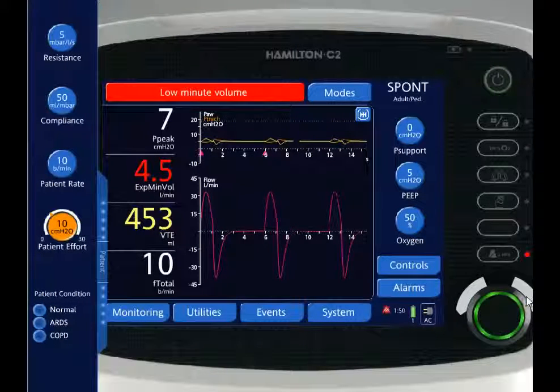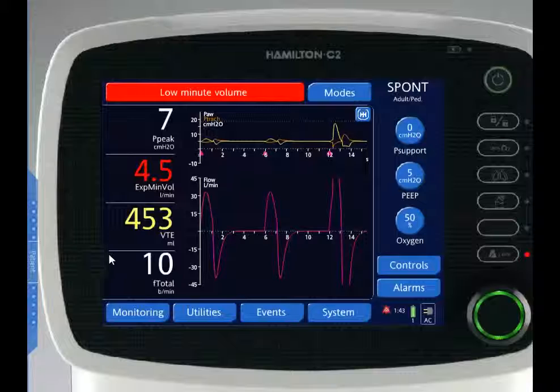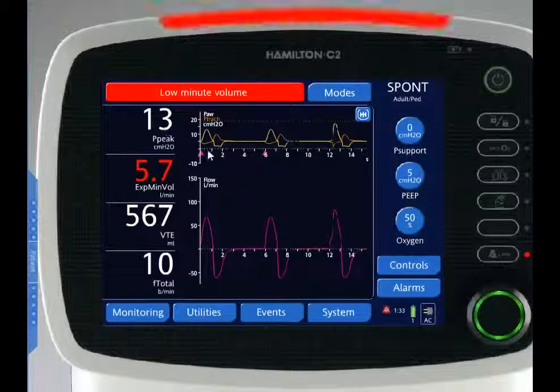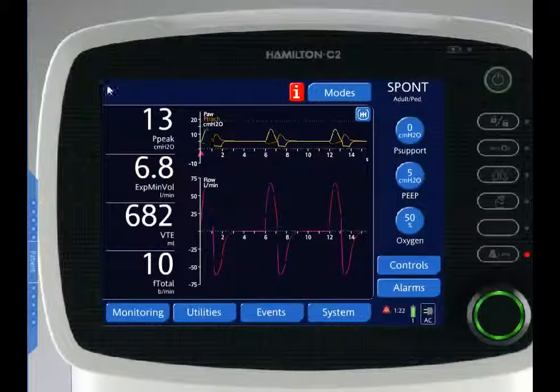Now let's change the patient's drive to 20 centimeters of water. The TRC, or automatic tubing compensation, is going to compensate quite a bit more. It's actually giving a pressure value of approximately 8 centimeters of water for this breath phase here. So that's automatic tube compensation. For more information, review the videos on servo targeting schemes.